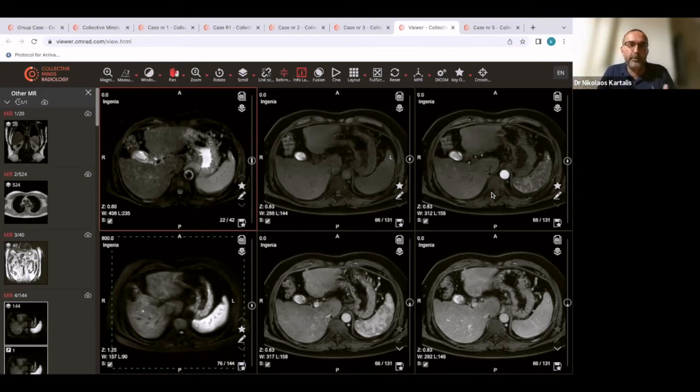Although you don't get this beautifully peripheral, nodular, discontinuous enhancement, you can still see that the lesion becomes smaller from the periphery towards the center. So this can help you. And I have been using this way of thinking a lot of years now, and in most cases it works pretty well. I don't know your experience, Martin, on the topic.